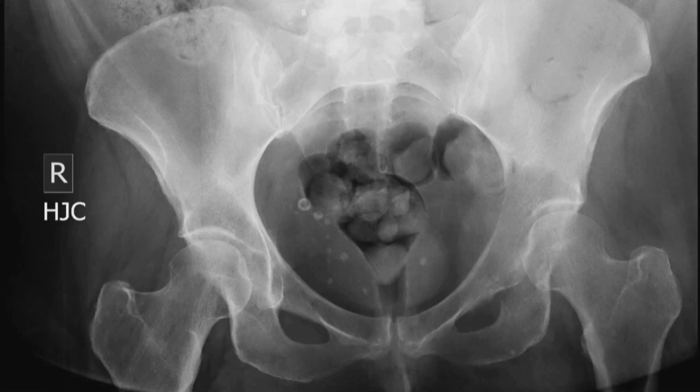Frontal pelvic radiograph in a 45-year-old woman. This demonstrates loss of the ilioischial line on the left with a subtle osseous lucency about the left acetabulum. The lucency extends into the acetabular roof. There is soft tissue density projecting over the left hemipelvis.